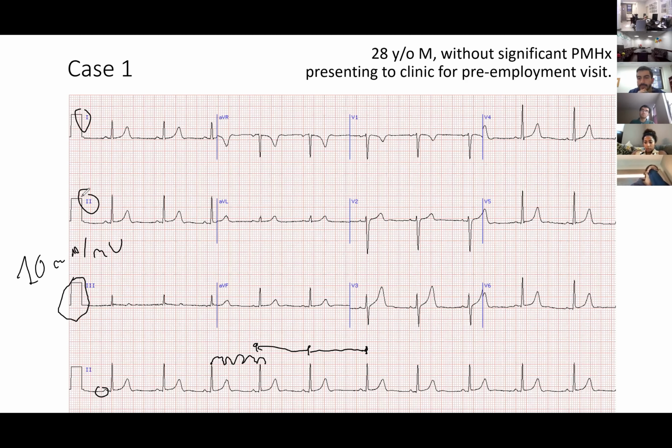Oh, and I just remembered right now. So the EKG is, I'd say, appropriately taken. Correct. Thank you. AVR is negative. I didn't want to interrupt you, but yeah, what you needed to look for is a positive P wave in lead 1, a positive P wave in lead 2, a negative P wave in AVR, and a negative T wave in AVR. If you have all those things, then you're pretty much certain that this is a well-taken EKG.